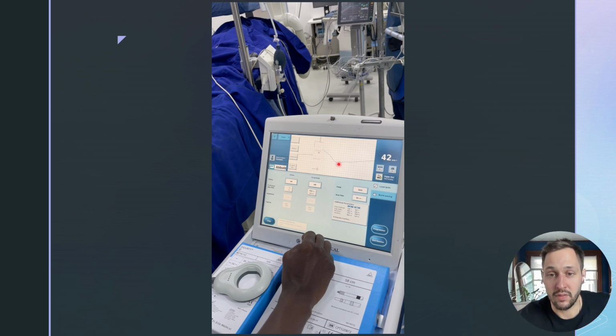If you saw it, you have this widened QRS here, but you can still see the remnants of it. It's about 50% of the signal. Once again, the injury current height is not necessarily the biggest issue. It's the injury current width. If you're thinking about it like a STEMI on an EKG, you're looking at that initial tissue damage. A wide injury current indicates that you've done damage to the localized tissue, which I will talk about in later slides.